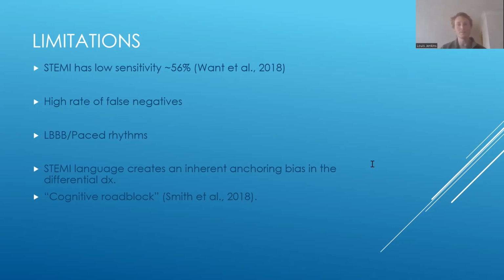And I'll give an example. We don't really look twice at the 22-year-old male who's presenting hyperventilating with tingling in his hands. Even if he's got 3 millimeters of anterior concave elevation, we will be very dismissive of an ECG like that. This patient will oftentimes end up in the ED or a discharge on scene, and is very, very rarely going to be taken to a heart attack center. But in a patient who's elderly with risk factors and maybe they're gray, diaphoretic, sweaty, presenting with that really horrible ACS-like chest pain, we will scrutinize down to the 0.5 millimeter on these ECGs, looking for reasons to take them to the cath lab.